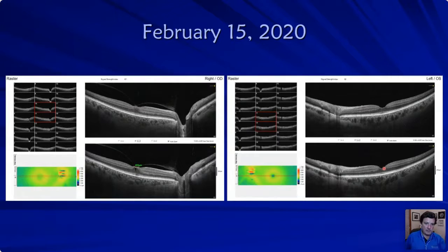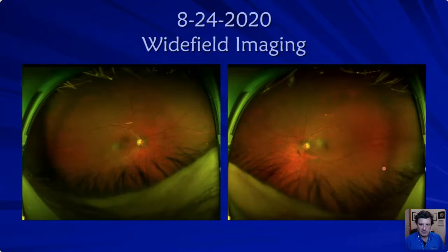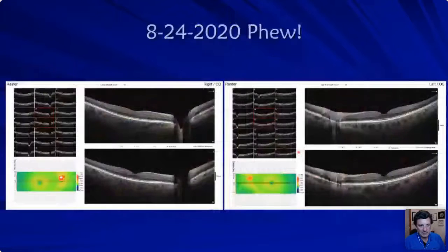Vitreomacular traction in one eye, pseudo hole in the other eye. And you can see right here the culprits, PVDs, in both eyes. So that traction, PVD pulling away, releases those astrocytes, glial cells, and as Joe pointed out, some of those RPE cells, and how they get up there. And again, look at this, a release and back.